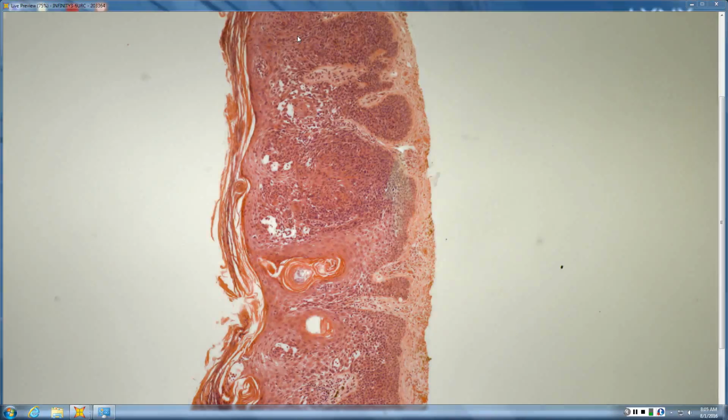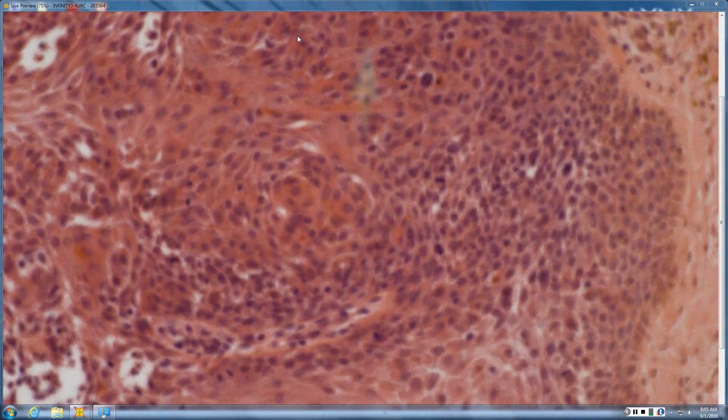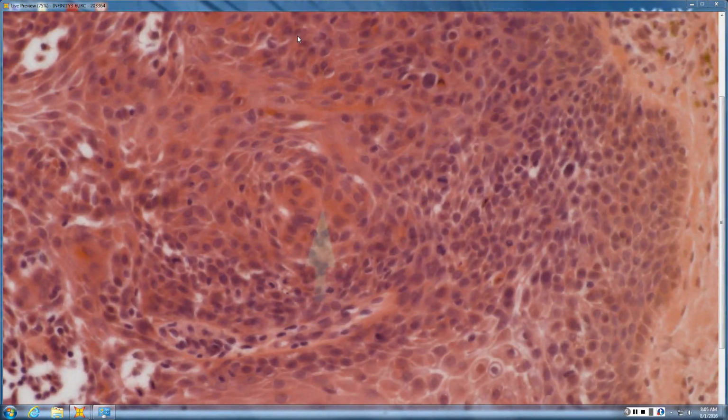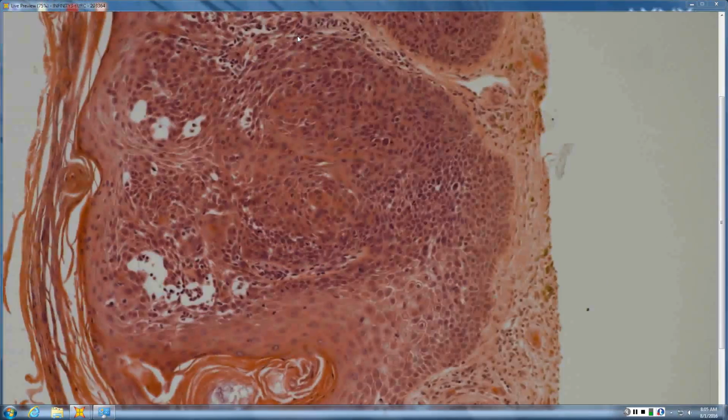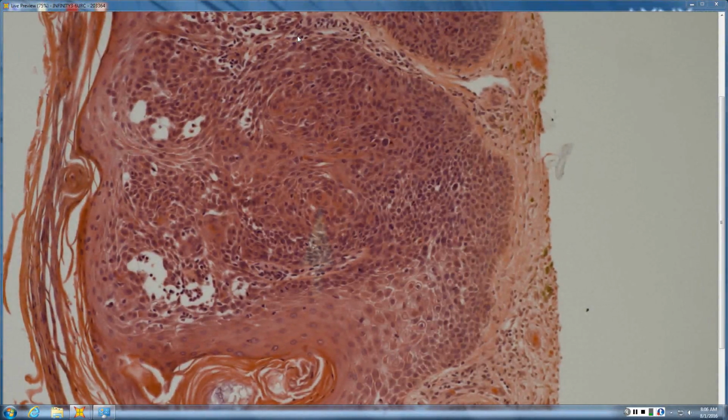Whereas if they're oval with a delicate nuclear envelope, with or without multiple nucleoli, with or without red nucleoli, with or without mitoses, they still tend to be benign. So lots of mitoses here, but architecture trumps, and squamous eddies, spindling, clonal proliferation, probably benign.